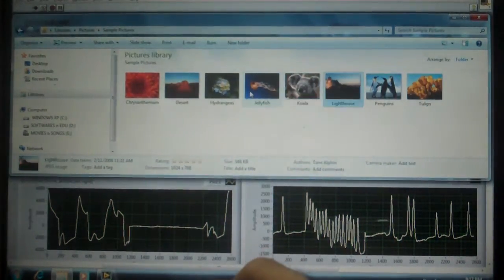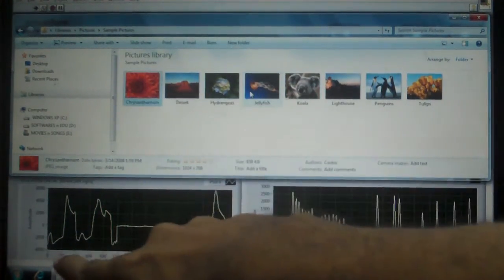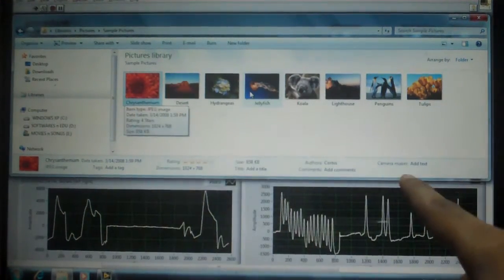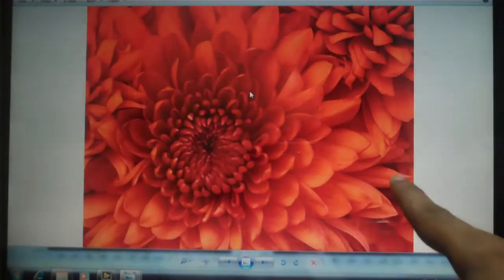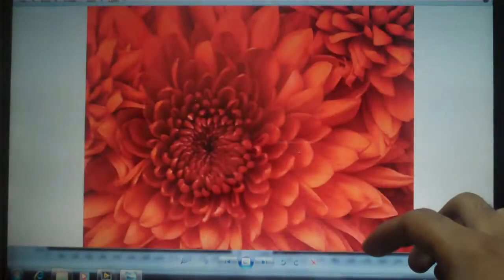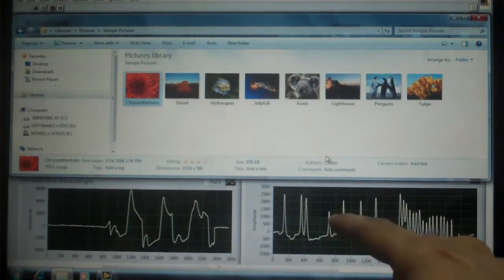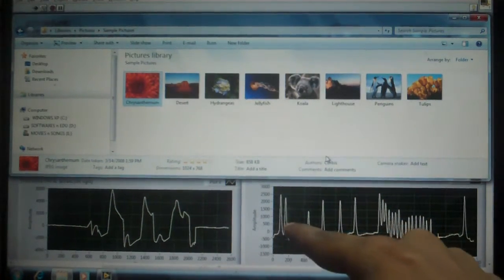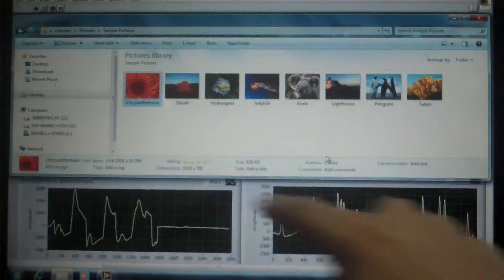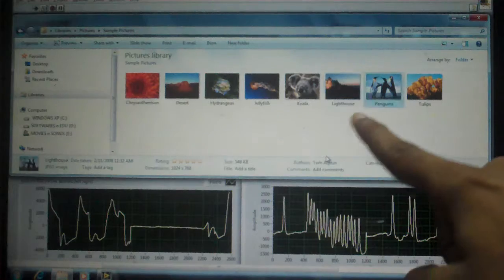So we place the cursor here. As you can see, the person has gazed towards his left, and towards his right, the cursor has moved towards his left. And now there will be a blink action, so that the person has selected the picture and it has been opened. And similarly for the next cycle, there will be a movement in the right direction. As you can see the right pulse here, there will be a movement in the right direction.